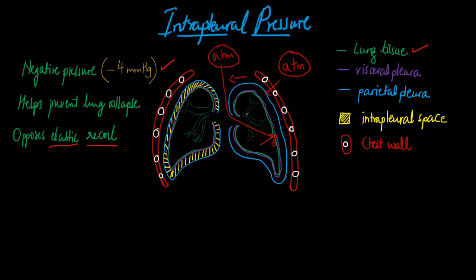And the third category when a pneumothorax can happen is called iatrogenic, as in insertion of a central venous catheter or insertion of a pacemaker.